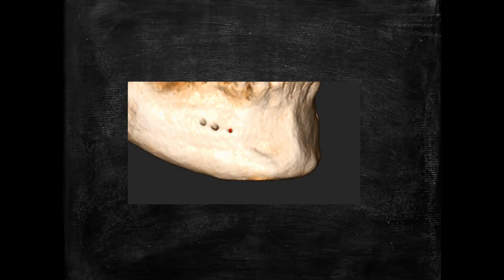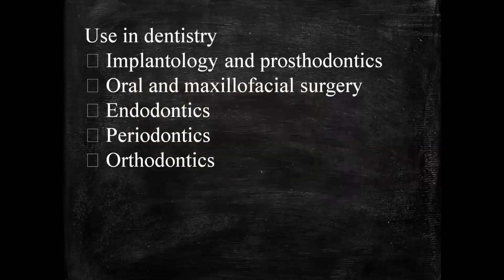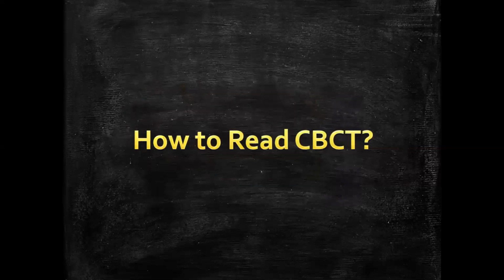You would never know that there would have been three mental foramen in an OPG. So 3D plays a very important role. Now, does it apply only to implants? No, it applies to every part of dentistry. It plays an important role in third molar disimpaction, endodontic procedures, periodontics procedures, and orthodontics. We'll go step by step to see how it plays an important role.